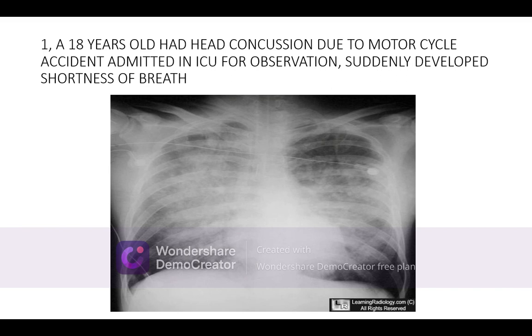Fungal infections usually cause macro or micronodular patterns. This is non-homogeneous opacity, non-uniform, so least likely. Tumor and tumor-like states will not cause this type of shadowing. Either they are macronodular or have a cannonball type of appearance. And the allergic reactions, extrinsic allergic alveolitis, will cause thick reticulations, reticular nodular patterns. So it is not extrinsic allergic alveolitis.